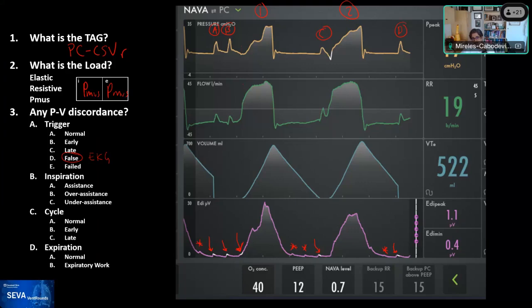Technologically, this is really impressive because you can imagine the amount of electrical noise occurring around the esophagus. There's the diaphragm, but there's also other muscles, and there's the heart. So this signal has to filter those. But as you now take a look, it becomes really evident that these are cardiac oscillations.